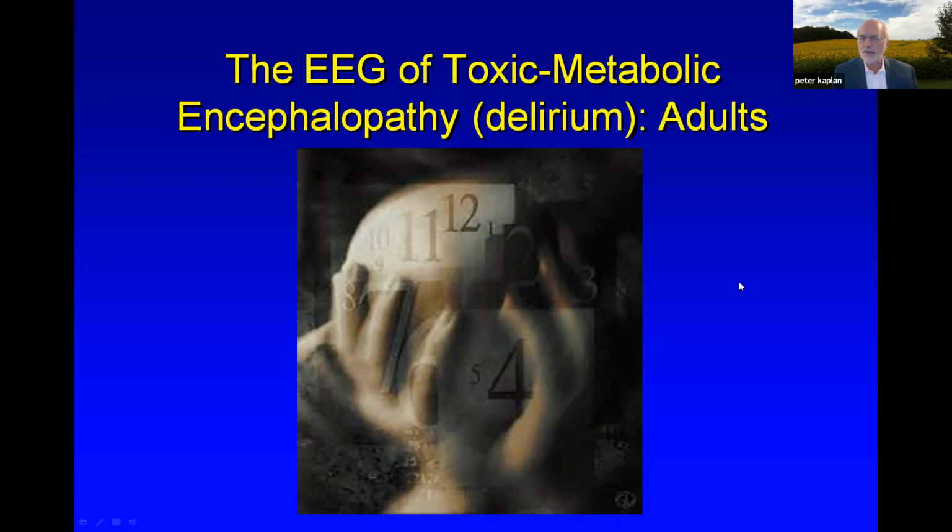Now, you are in your training certainly well versed in images that you see on CT and MRI, and they look certainly more intuitive to understand. The EEG, though, of course, is a tool which shows a different aspect of neuronal function and reflects metabolism. And it is something that's somewhat less familiar, probably because trying to interpret squiggles versus a picture is just a less intuitive prospect. But I'm going to take you through the different patterns and emphasize in what ways EEG is revealing and show you many of the different aspects.